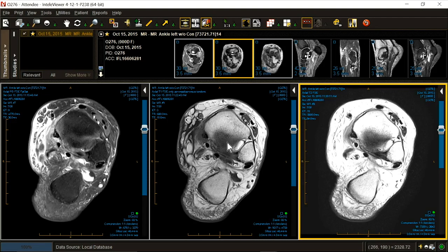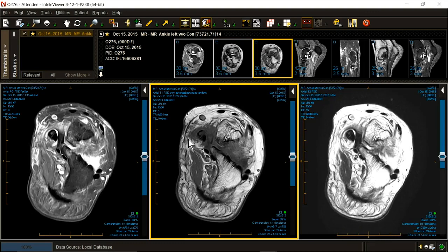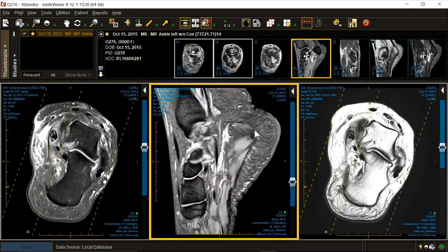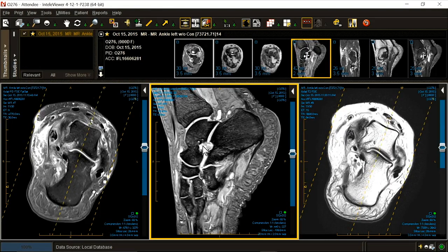You could add or put in the body of the report that the medial retinaculum is also torn. And then I probably, in this case, because it's so prominent, would include in the conclusion the sinus tarsi synovial reaction. PT tear.